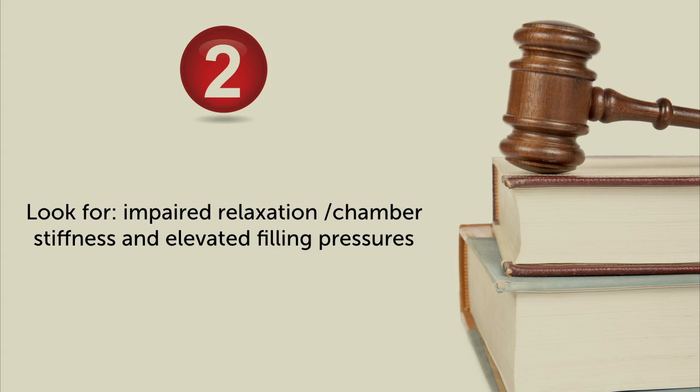So that was the first part. Number 1, simplification. Number 2, basically the guidelines state that it is our intention to use a very clinical approach and to look for signs and hints for diastolic dysfunction, impaired relaxation, which can be seen in the 2D image, for example, left ventricular hypertrophy, enlarged left atrium, maybe even bulging of the interatrial septum, maybe an expanded left atrial appendage, and of course, directly looking at filling pressures. So the first important part is clinics first. Do you agree with this? And don't forget the 2D image. That's also very important.